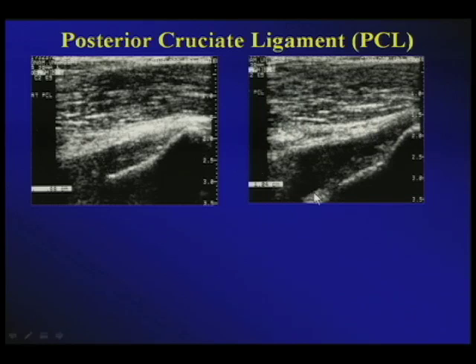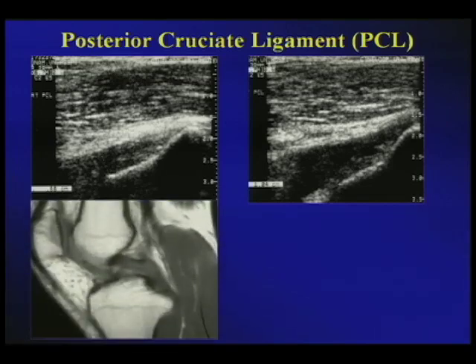Case in point, in the same individual showing the contralateral knee, you'll notice that the contour has changed from something like a triangle to a convex upward contour. Also, look at the difference in size. It has now become almost twice the size of what the normal asymptomatic posterior cruciate ligament was. For confirmation, it is always helpful to look for MRI.